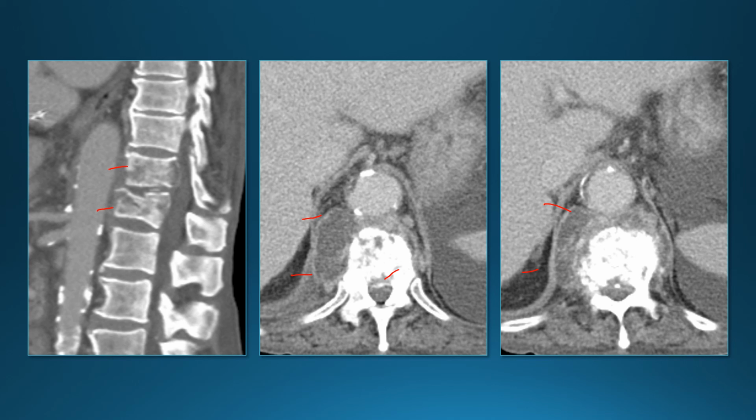We looked carefully. The patient also had a lot of ascites here, which turned out to be tuberculous peritonitis, and this was a tuberculous discitis osteomyelitis. And I think, again, the helpful sign here is that there is a lot of vertebral body involvement on the CT. You can see partial collapse here, a lot of lucencies in the vertebra, and yet the disc involvement is not as impressive. So this was a tuberculous osteomyelitis.